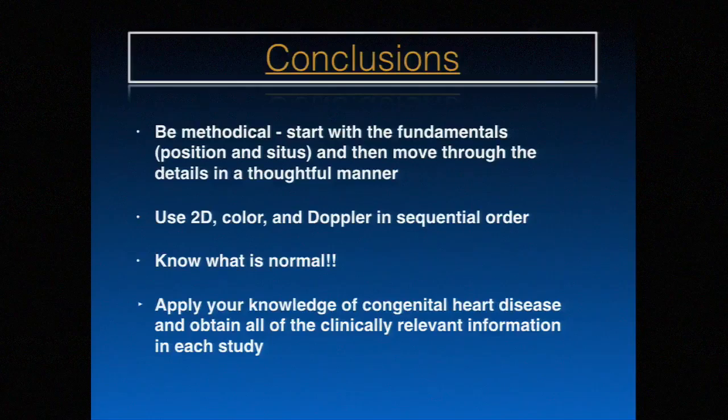So again, the biggest advice I can give when you're doing a fetal echo is just to be methodical, to always practice in the same predictable pattern. For me, it's 2D first, I make a decision, color helps me confirm, pulse wave Doppler if I need it, and then knowing what's normal is going to be the number one thing you can do to recognize heart disease as well as obtaining pristine images.